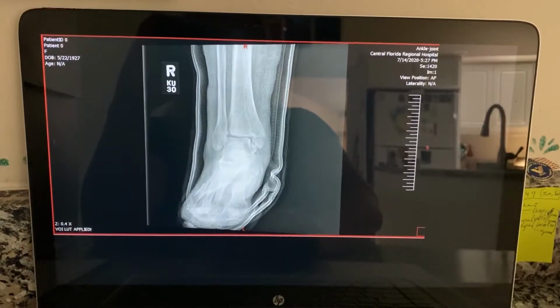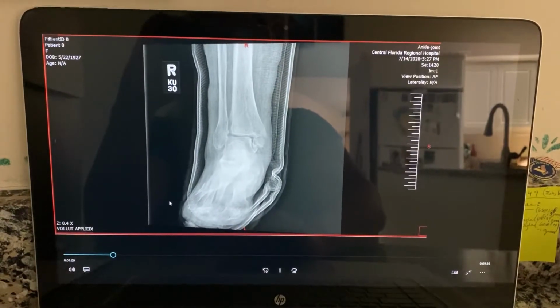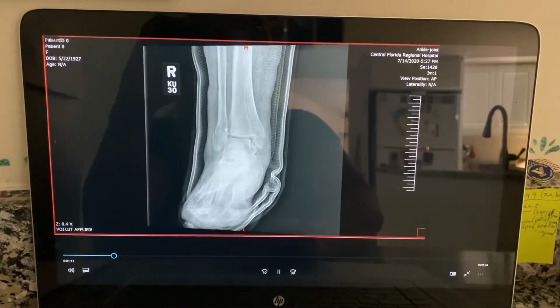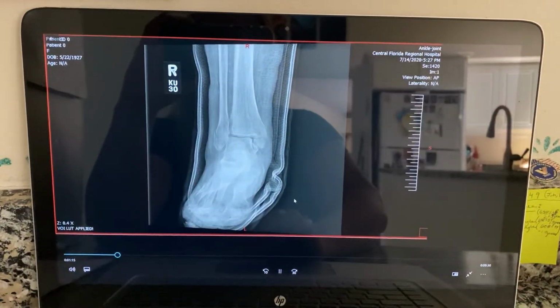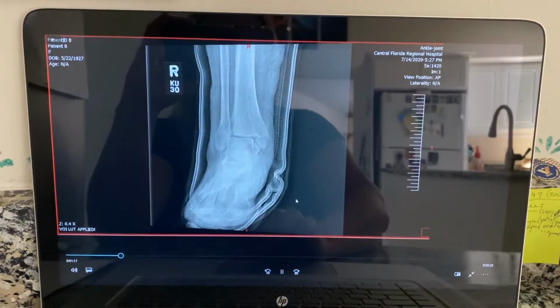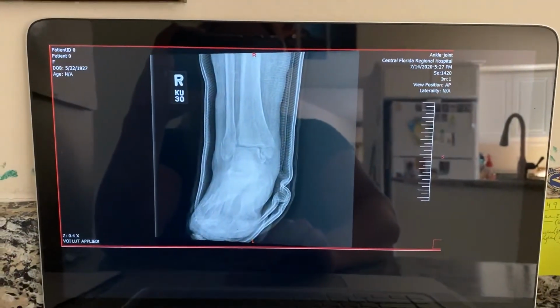Collimation is present to the lateral margins of the ankle to include her distal tibia and fibula and proximal half of the metatarsals. Collimation could have been a little tighter to clip off her toes.